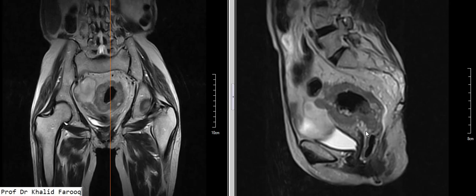Here we have a female patient who presented with history of bleeding per rectum. We did her MRI of the pelvis. Here we can see there is circumferential growth involving the rectum. This rectal growth can be assessed with the help of barium enema, CT examination and MRI. So these modalities can be used in assessing this lesion.